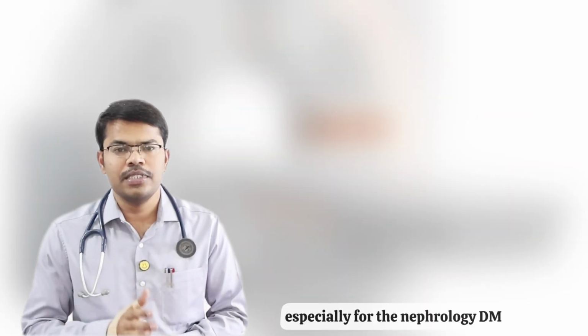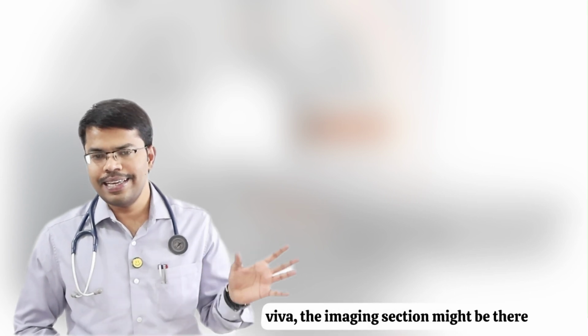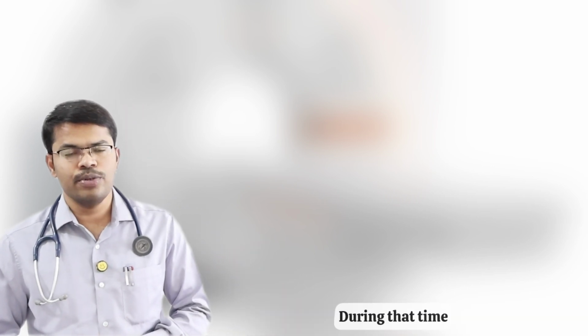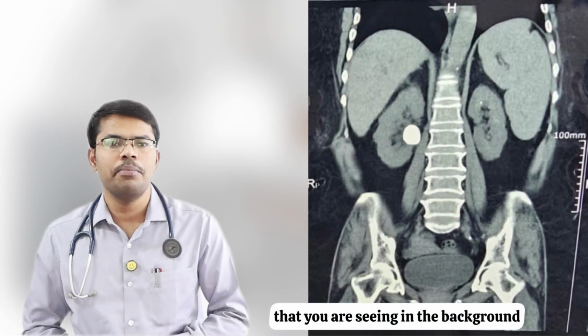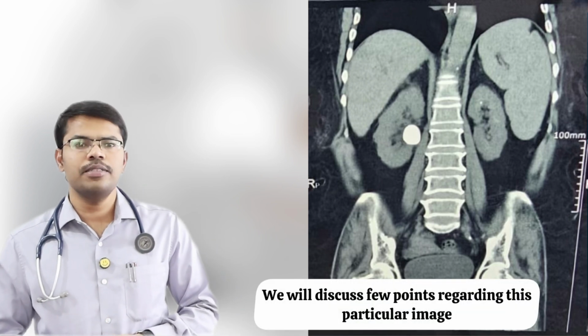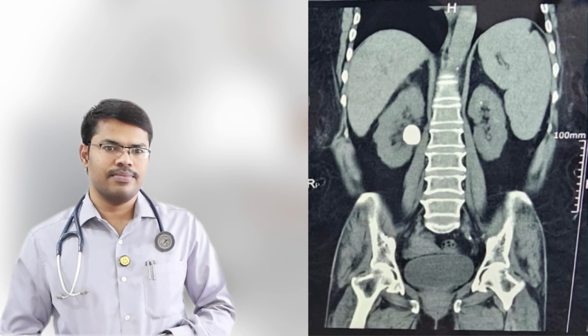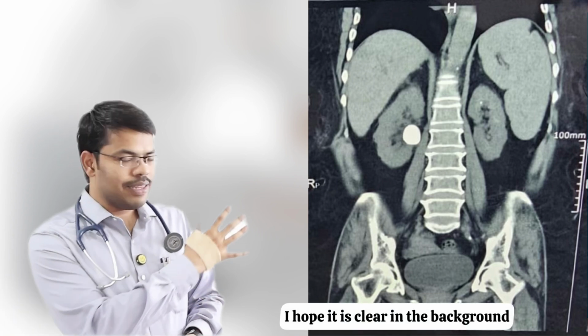During the exam, especially for the nephrology DM or DNB resident viva, the imaging section might be there. During that time, you might get these kinds of images that you are seeing in the background. So we will discuss a few points regarding this particular image. You can go through the image. I hope it is clear in the background.